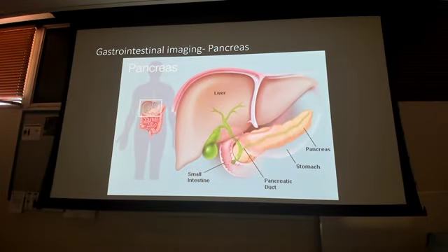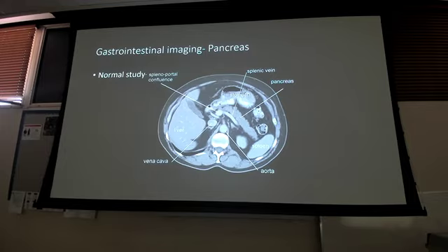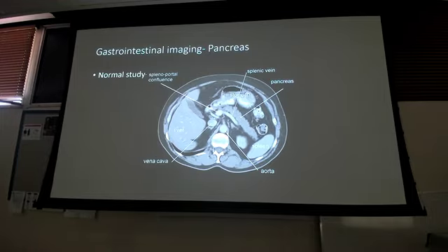Pancreas sits right by the liver. Sits right in that nice little duodenal area as well, okay? CT for a pancreas. You will almost never see a pancreas on an x-ray unless what? We talked about it. Calcifications, right? Unless this thing is a nasty calcified pancreas due to chronic pancreatitis, probably potentially leading towards pancreatic cancer, you should almost never, ever see it on a regular x-ray.